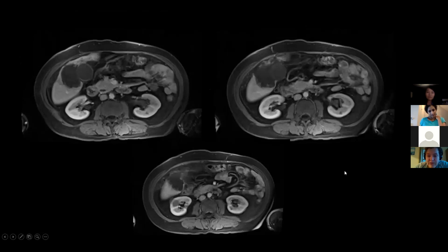Post-contrast images. Oh, wow. Now I'm leaning towards infection. Yeah, okay. So I'm still with abscess, with intrahepatic cholangio. Ah, really? We'll have to take a vote. Was the patient febrile?